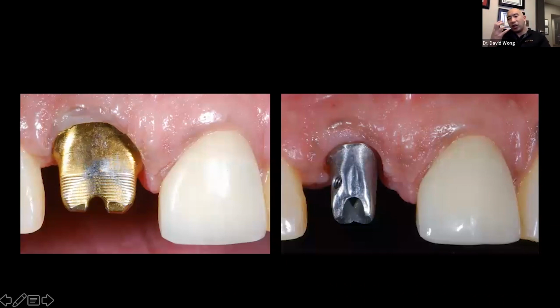And it's going to give you enough room for your crown to seat and displace the tissue perfectly, to where it's going to match perfectly with number 9. But everybody says, well, what about the custom abutment? I heard custom abutments were better.